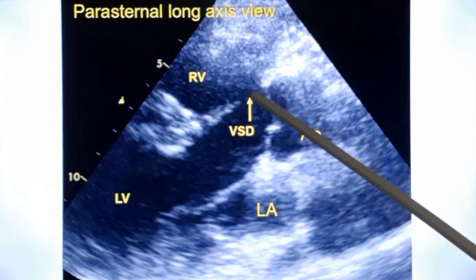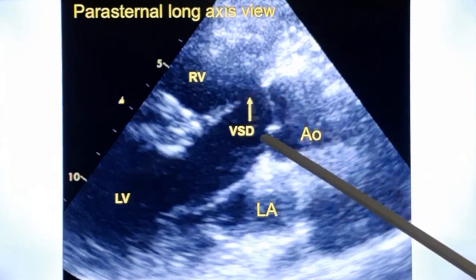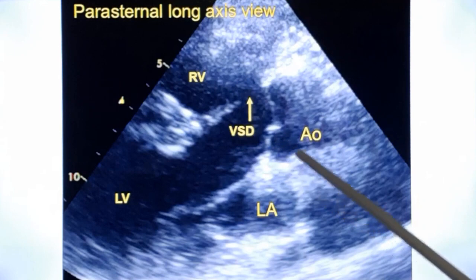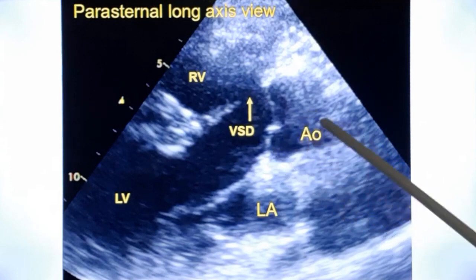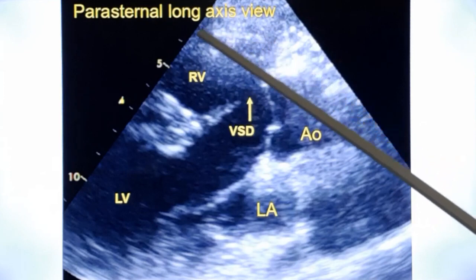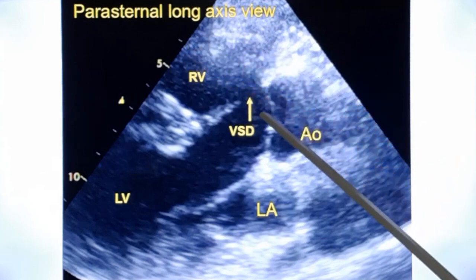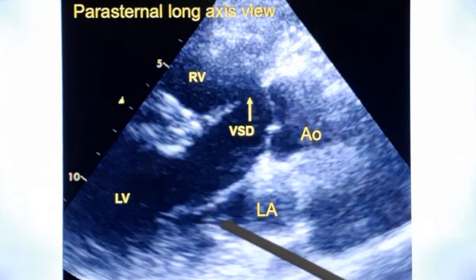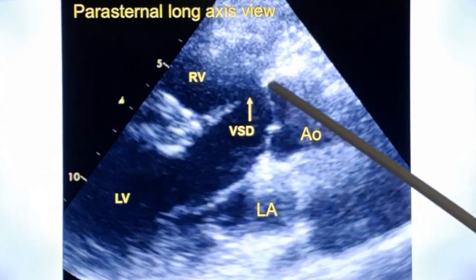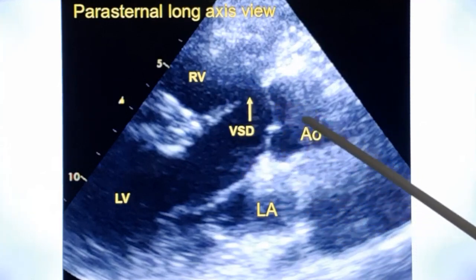Yet the override is not sufficient to say that this is double outlet right ventricle. Again, as I mentioned, all features should be assessed on moving film, moving videos, and not just a still frame. Here, there is also a suggestion of hypertrophy of the free wall of the right ventricle, which can occur in tetralogy of Fallot.